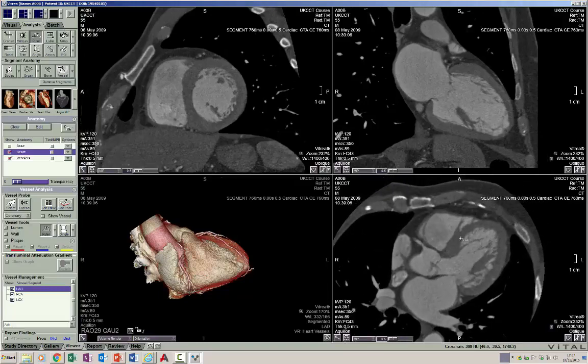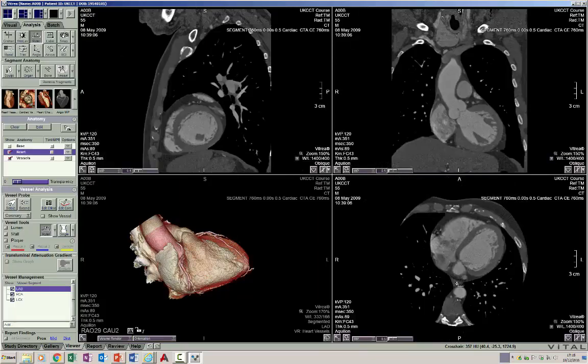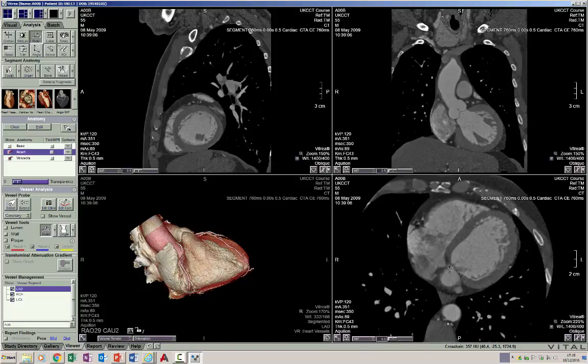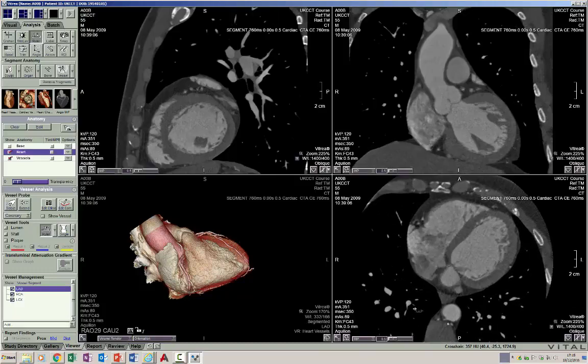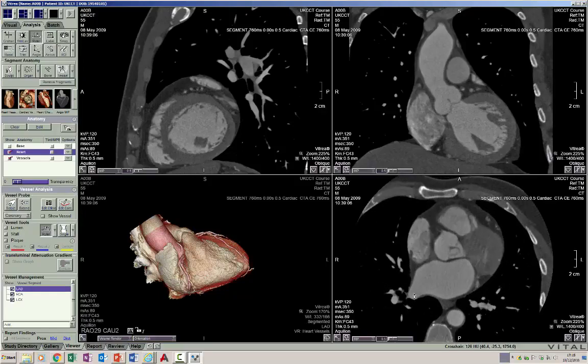And again, you can see the pericardium here. And the layer of fat that's lying between the pericardium and the myocardium is the epicardial layer of fat, and the fat that lies outside the pericardium is the pericardial layer of fat. Let's quickly look at the anatomy of the mediastinum, which we have seen already in the first session, but let's just quickly go through it further.